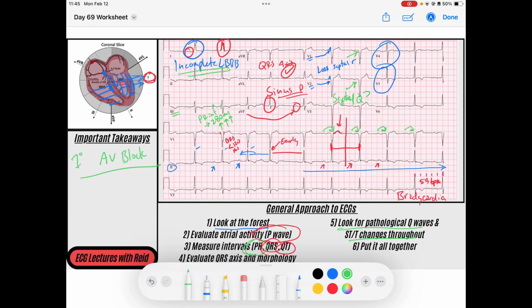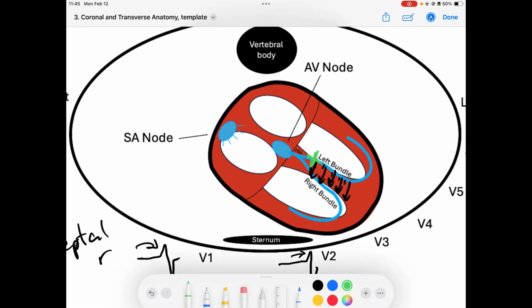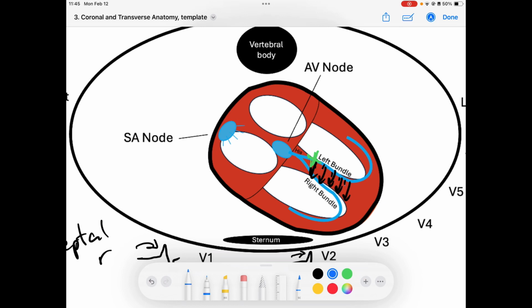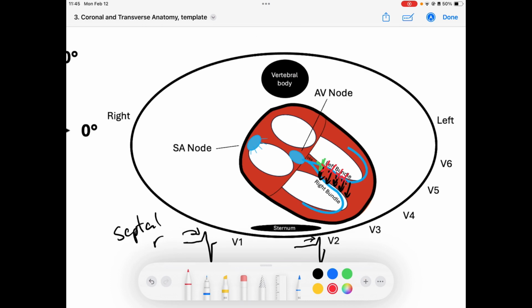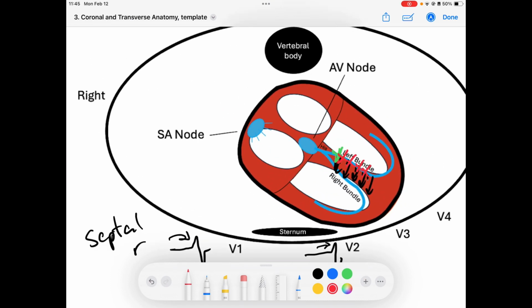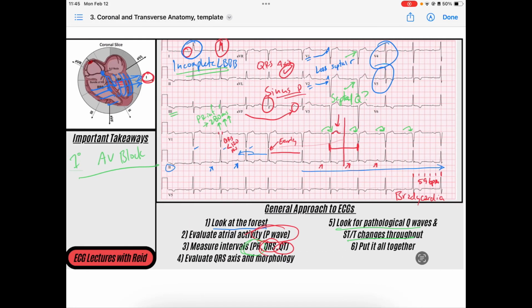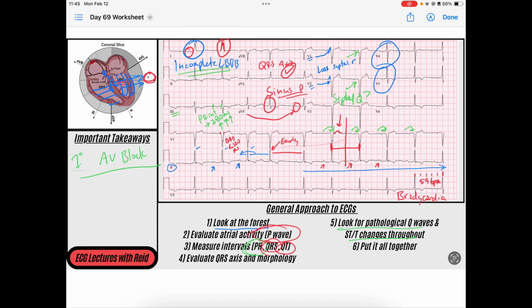Well, if you think about it, right? If the septum is what is giving rise to these left bundle fibers, right? If there was an infarct that occurred through here in the septum, you could, in theory, also have a bit of a left bundle branch block, as the left bundle could have also been a part of that infarction, right? So we got a little bit of double jeopardy here, in the sense that, which one came first?